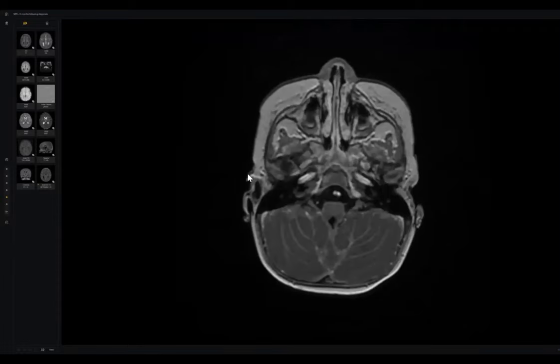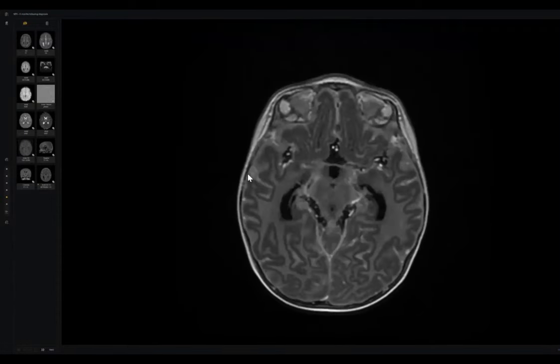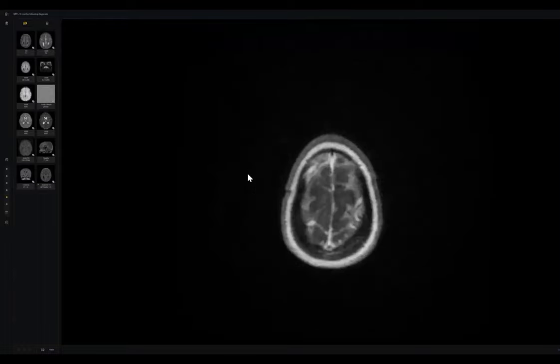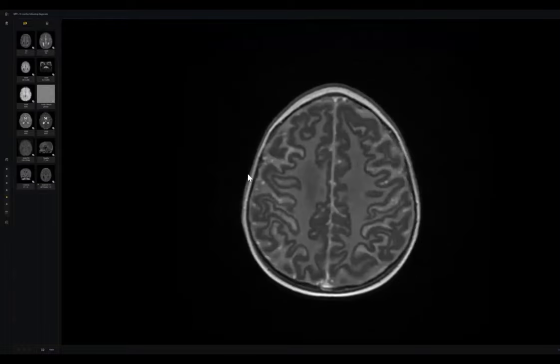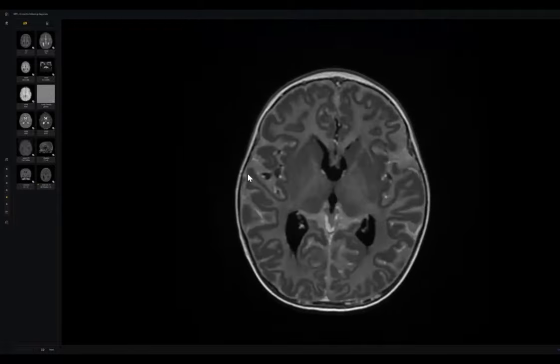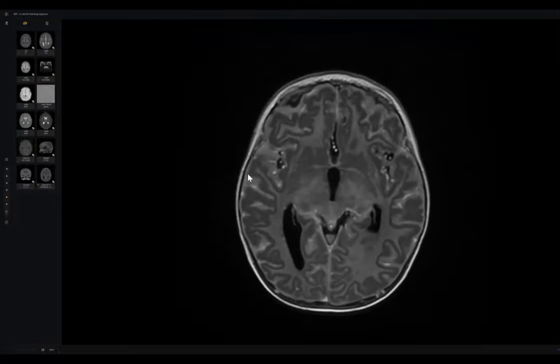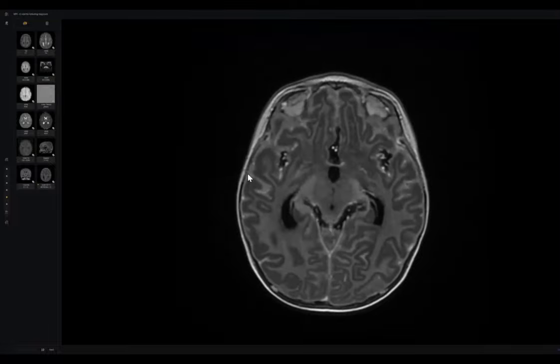The fourth ventricle appears to be normal. I'm not able to see any intraventricular neoplasm. Yes, in the region of the foramen of Monro, I could see an enhancing mass lesion. Nothing else. So conclude, please.